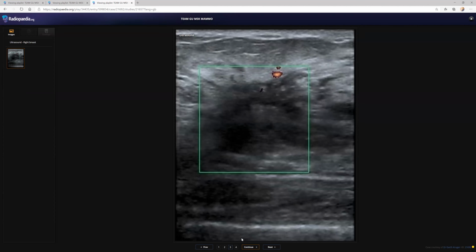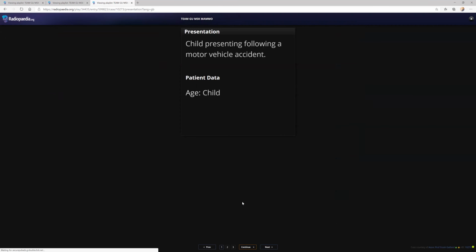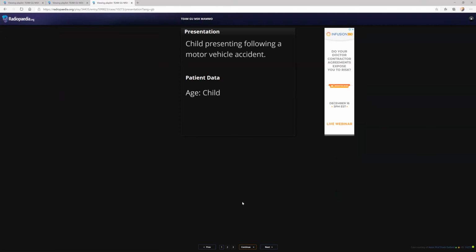But it was a case of radial scar. In a radial scar, you can see some lucency centrally with radiating bands without any mass-like appearance. So you just have to give the differential diagnosis of radial scar also. Otherwise, it's good, because in our normal practice, we definitely will think that it's a malignancy, and only after biopsy can we find out that it is a radial scar.